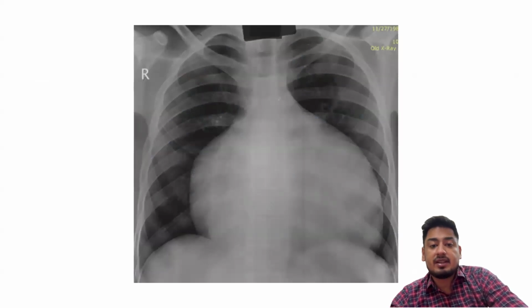So the findings in this X-ray are, you can see there is RA enlargement, as can be assessed by the diameter from the lateral border of the vertebra, and also it is covering more than 3 vertebral spaces. And then there is a huge cardiomegaly with a cardiothoracic ratio of 0.7. Also, we can see pulmonary oligemia is there. That is, the lung field is more darker. And there is this very box-shaped heart. So, given a clinical history of cyanosis, this X-ray is more suggestive of Ebstein anomaly because of the pulmonary oligemia, box-shaped heart, and significant RA enlargement.